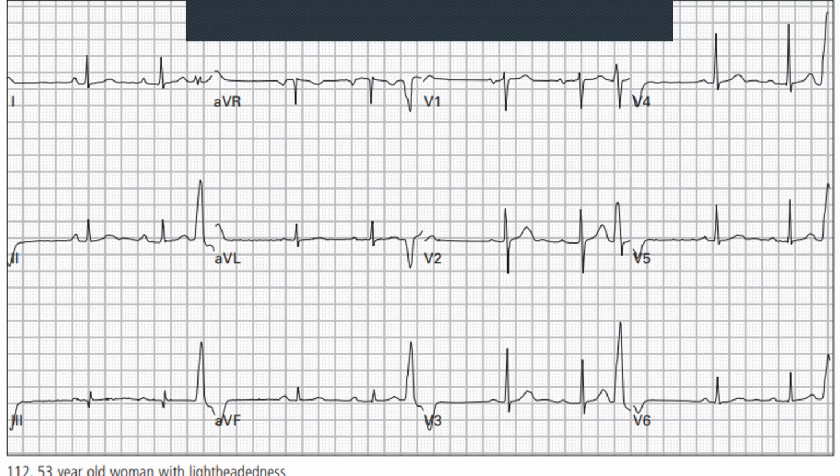There's something wrong. So what we have is instead of lub-dub, we have lub-dub, lub-gap, dub. Do you get what I mean? So there's something wrong with that. Okay. Now we don't have the full rhythm strip over here, but we can already see something is happening, right? Something is going wrong.